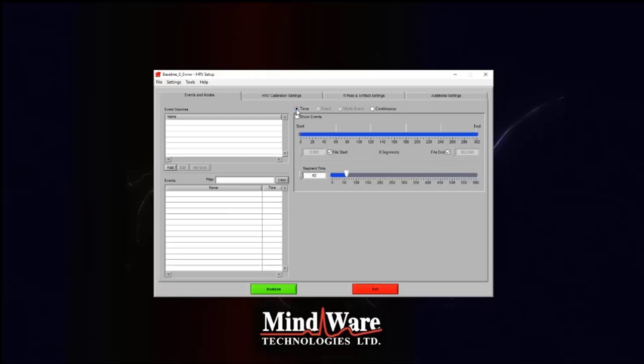So one thing to note when we're doing this time mode is that in almost all cases, we're going to want to standardize the amount of condition time between participants. This doesn't always need to be down to the millisecond, but it certainly can help if we can standardize it in some way so we're not comparing 30 minutes of data to 20 minutes of data. We don't want that much of a shift in the amount of data that we're comparing between the subjects, but certainly a few seconds is okay in most cases.